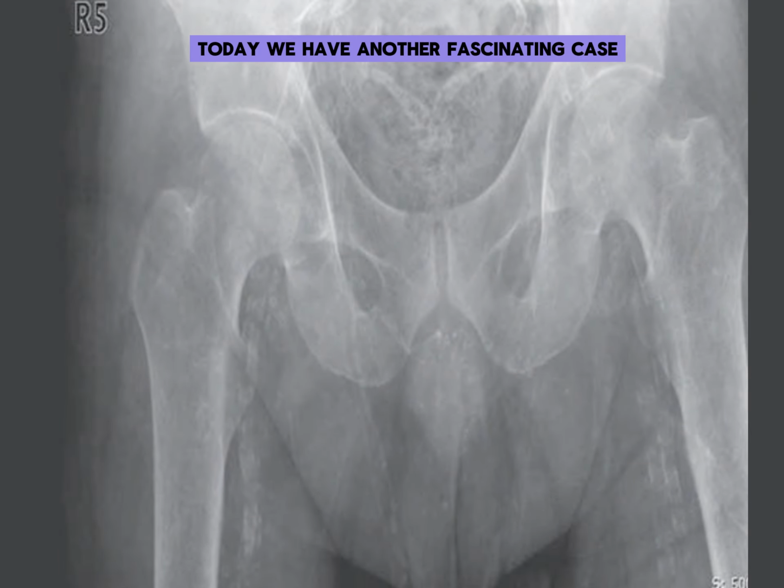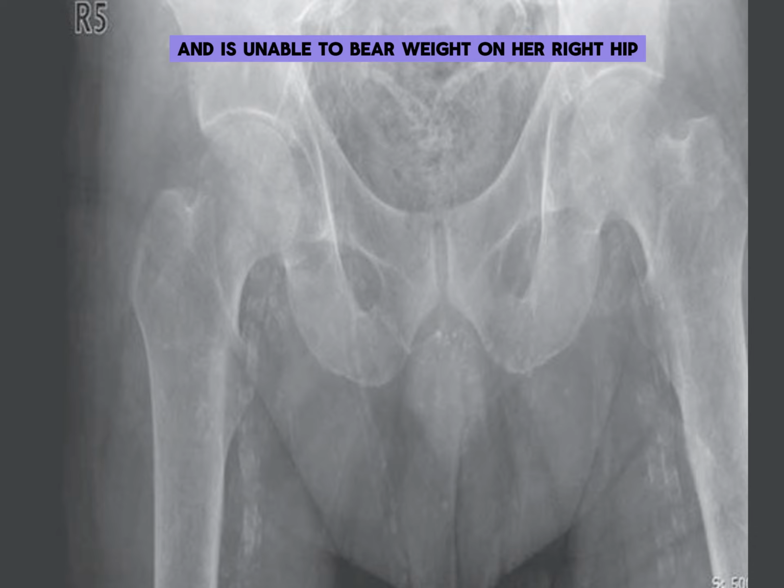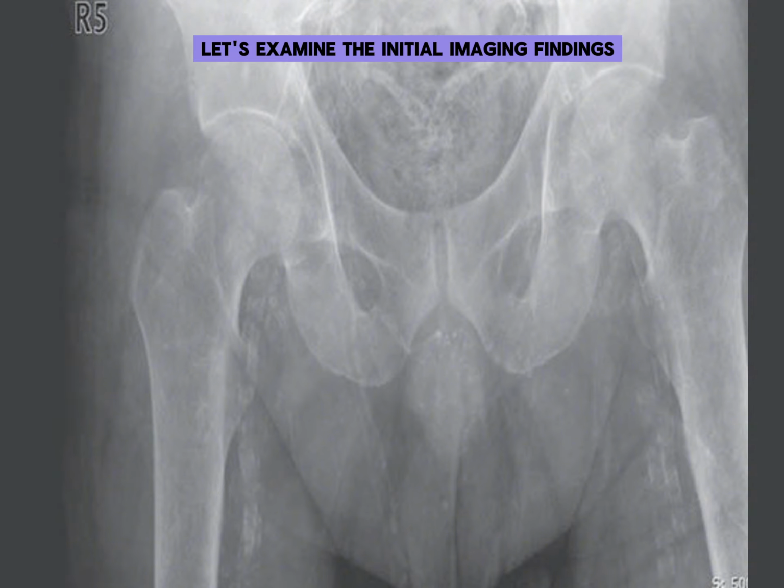Today we have another fascinating case to test your diagnostic skills. Let's jump right in. Our patient is an elderly woman who has experienced a fall and is unable to bear weight on her right hip.